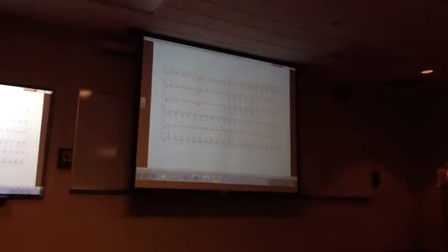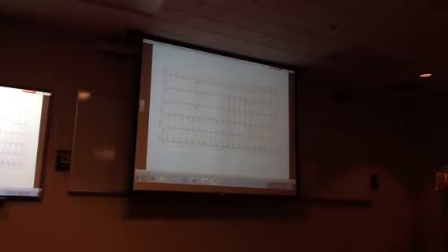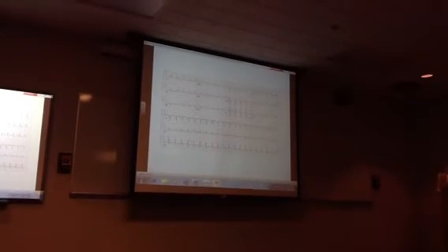Sure. So, is it a regular rhythm? What do you look at? And you can get help from your friends. What do you look at to determine if it's a regular rhythm? I'm just not asking about normal sinus mechanism. I just want to know if you took this fellow's pulse, would it be regular? And why?